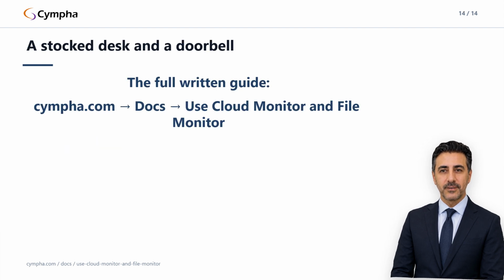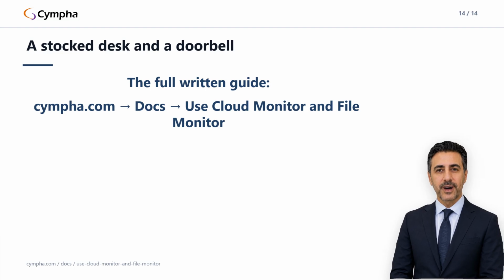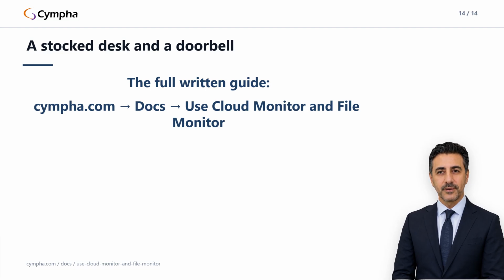You now know the agent's two watchers: the sync engine that keeps a workstation stocked with your cases, and the doorbell that makes sure no scan dies forgotten in an export folder. Pick the combination that matches the desk. Cloud Monitor for anyone who receives cases, File Monitor for anyone who produces scans, both for the desk that does both. If you're a designer, the next lecture to watch is the one on opening downloaded cases and refining plans.